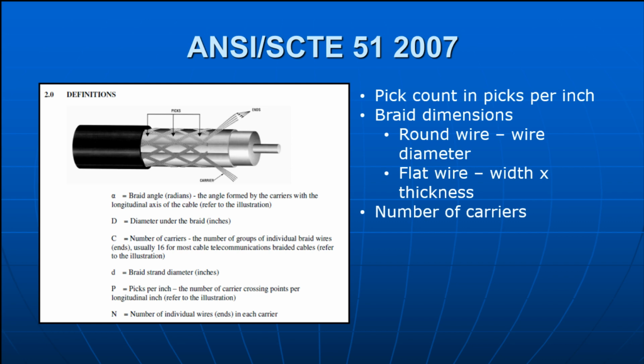The CathCAD software provides a measurement of braid density by computing the surface area coverage. A value of 0 indicates that the surface area coverage is 0, while a value of 100 indicates that the surface area coverage is full.